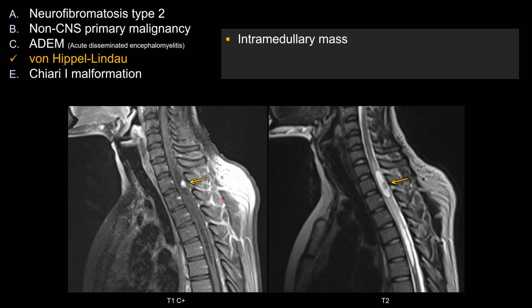Hemangioblastoma is distal third. Now, this lesion does have a characteristic look of a cystic component with an enhancing mural nodule. So that's fairly good for hemangioblastoma, both in the spinal cord as well as in the brain. Most of the time in the posterior fossa, you see a cystic lesion with an enhancing mural nodule.